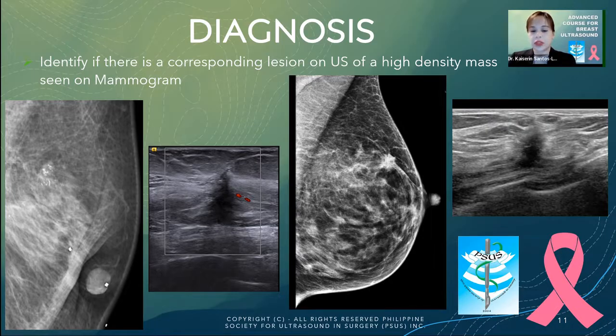Most of the official ultrasound results already aid our diagnosis of a possible palpable or visible lesion or an area of interest because it is painful or there is some discomfort that the patient can feel. Often, we encounter patients with both mammogram and ultrasound already.